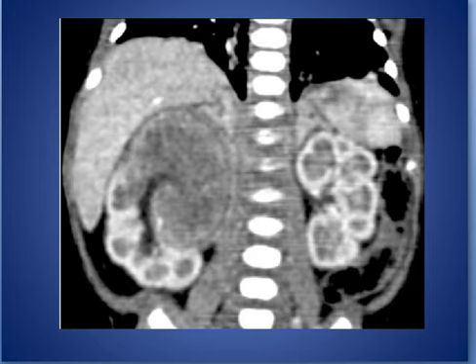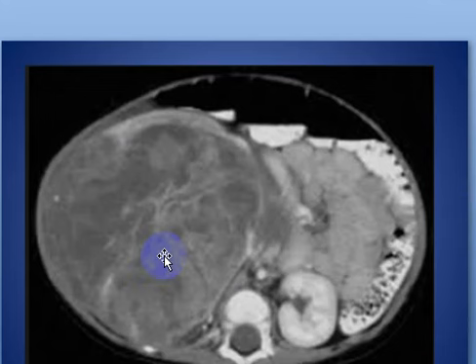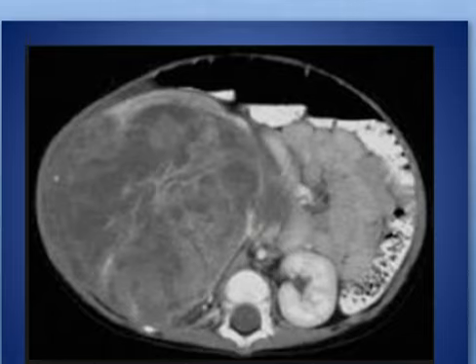And here, another patient with congenital mesoblastic nephroma involving the right kidney, upper mid portion. Here, another patient with congenital mesoblastic nephroma of the right kidney.